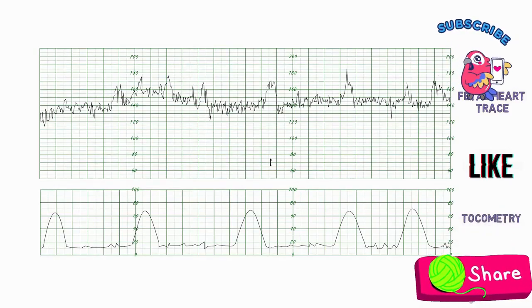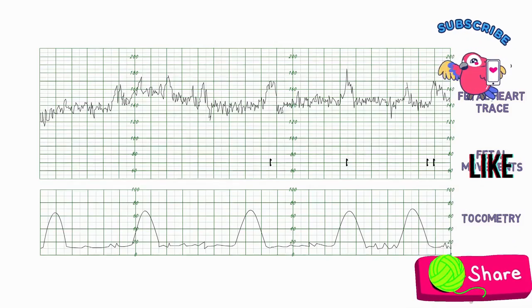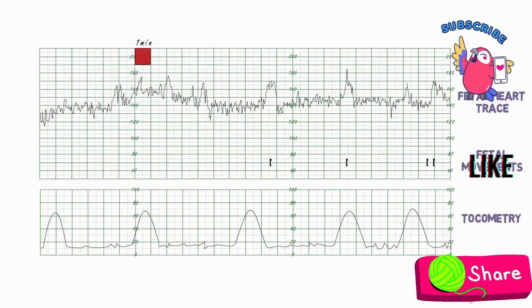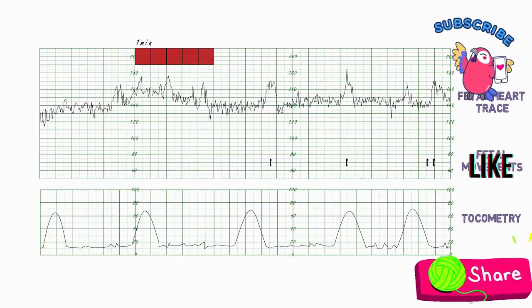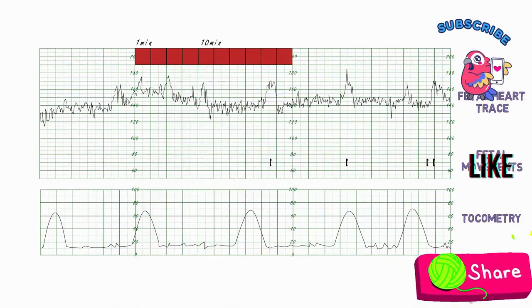These marks are markers of fetal movements, which are indicated by the mother as she presses the pressing button. Now, every small box on the graph paper represents 1 minute. The CTG is divided into 10-minute blocks, represented by 10 small boxes. Good, so those are the bare basics.